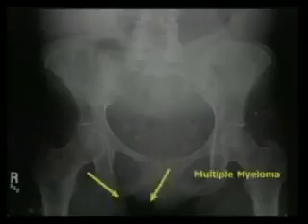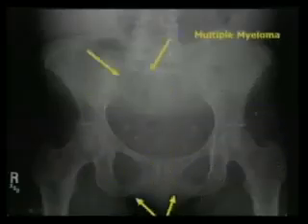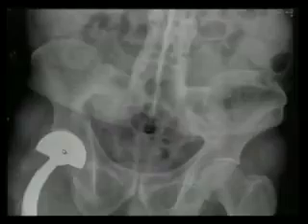If they were worried about a metastasis, which primary malignancy is almost 100% lytic? Kidney. Renal. Here, this is a big lytic process. Patient had a right total hip arthroplasty.